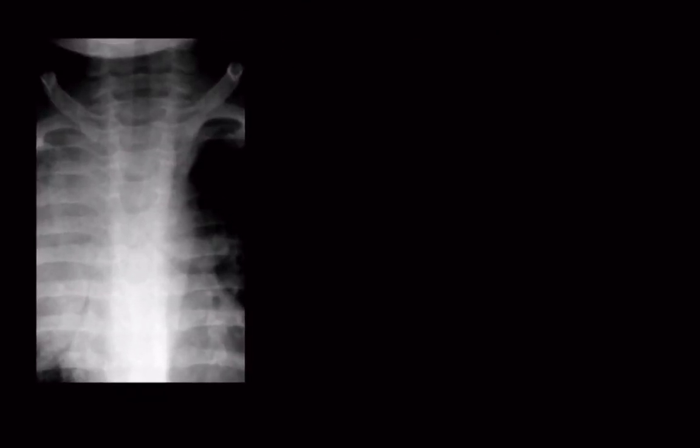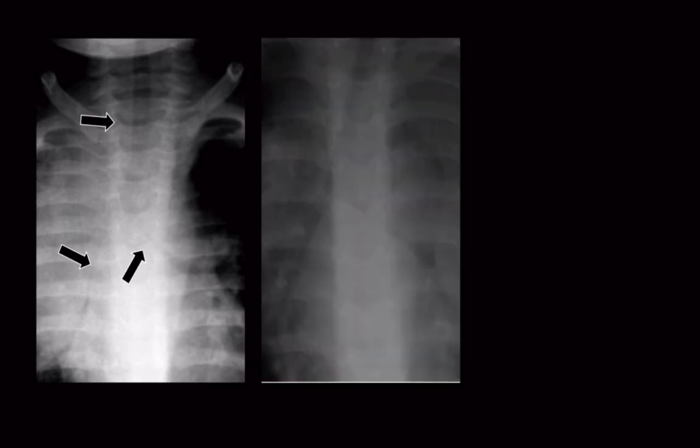So I've cornered it in just so that you can see the displaced trachea. So trachea in a child should be to the right because the aortic arch is on the left. If you see the trachea pushed over in a child that's not rotated, then you should worry. And there's a compressed bronchus intermedius, a compressed left main bronchus. I don't need to see the lymph nodes, and as you can see, I'd have a lot of trouble in this case because of the airspace disease or the pneumonia that's going on around it.